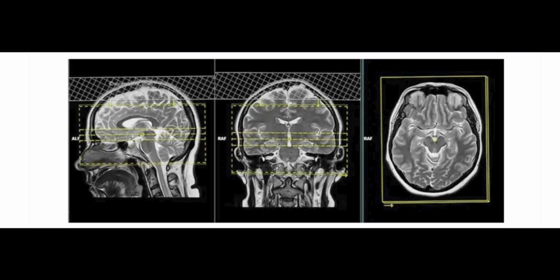Plan the axial 3D block on the sagittal plane, angling the planning block parallel to the genu and splenium of the corpus callosum. Ensure that the slices are sufficient to cover the entire circle of Willis. Verify the planning block in the other 2 planes.